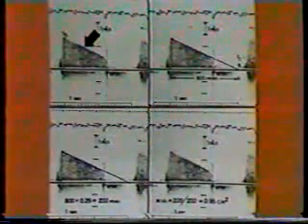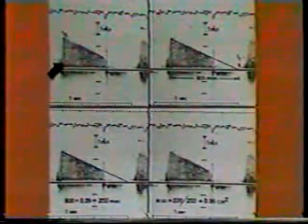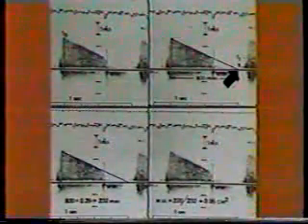This is a continuous wave Doppler spectrum from a patient with mitral stenosis. The maximum velocity has been identified, and a perpendicular has been dropped from it to the baseline. A straight edge was placed along the spectrum, and the deceleration slope has been drawn. This slope has been extended beyond the Doppler spectrum until it reaches the baseline, or zero velocity. The time interval between this point and our original perpendicular is the deceleration time, which in this case is 800 milliseconds.